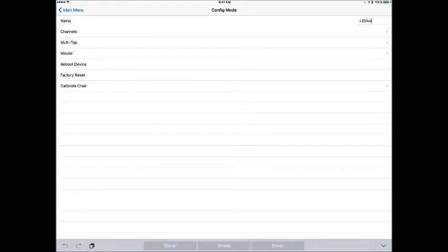I think that's important in settings where there are going to be multiple iDrives in a building, because you'll potentially see 5 iDrives on your first screen when you're trying to connect to it. So if you do have a tendency of being in an area where there's going to be multiple iDrives, you might want to give it a name. You might want to give it a sequence, an identifier that you can use within paperwork that you have. But right here, just for the simplicity of this video, we're going to keep it as iDrive.